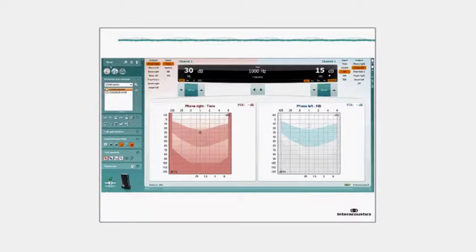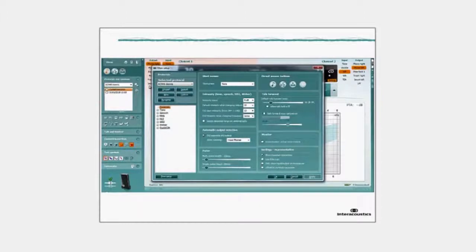So what I'm doing here is you can see that I'm going into Menu and Setup and AC440 Setup. For the example of this video, I have used a custom protocol titled AC440 Dennis, and notice how it's shown in the main setup window here. And also in the background, we have the protocol in session reflecting the same protocol.